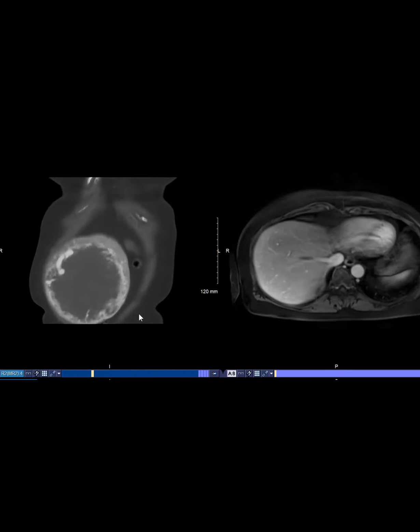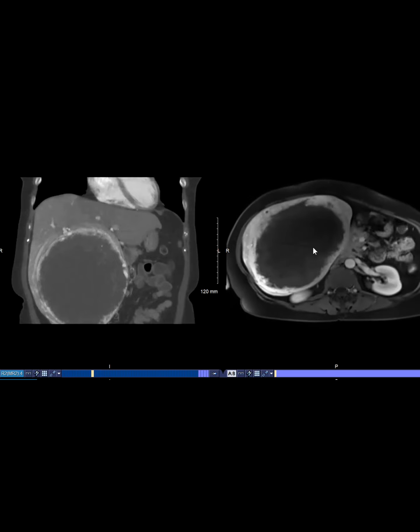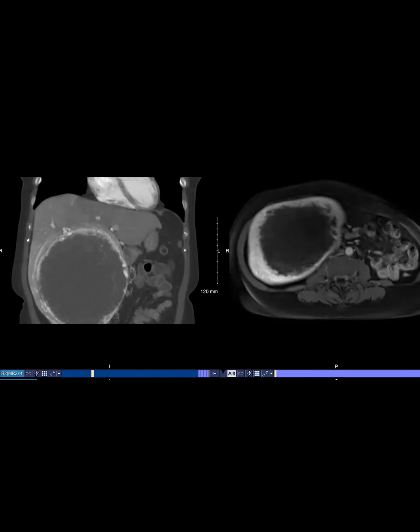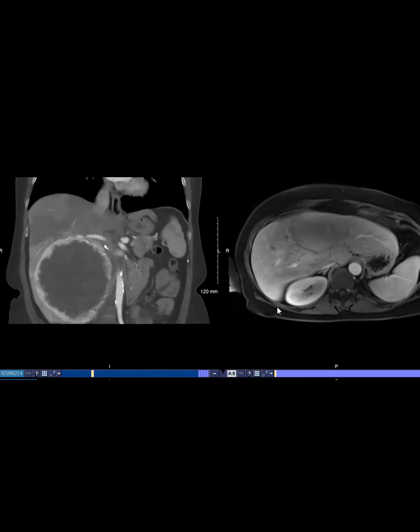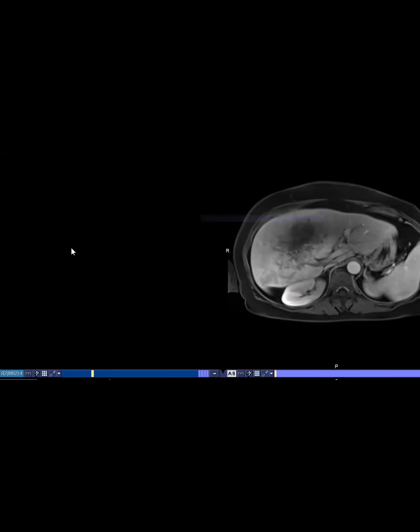And I agree. Angiosarcoma is a good thought, or some sort of very aggressive HCC. She's young, she has no risk factors, potentially some sort of very aggressive form of fibrolamellar. But this ended up being atypical solitary fibrous tumor, and this is from 2015. So I guess multiple years. Retrospectively, Victoria, is there progressive enhancement we saw from the arterial, like that rind kept getting thicker and thicker on the more delayed images?